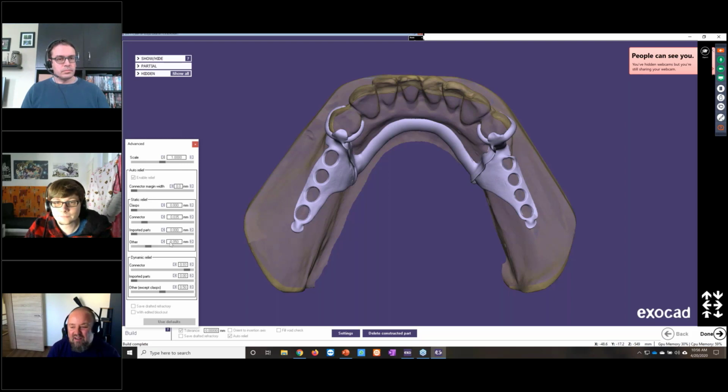And yeah, this is something hard to explain. To be short, it's a kind of tool compensation and compensation of bad scan quality and triangulation all together. So it's seeking for edges on the triangles and doing a compensation in those areas to create gaps in such areas who can create problems in the fitting later. To be honest, I have no experience with real values here. Yeah, it's hard to suggest specific numbers, and like we said, it's something that we'll have to do through trial and error on your actual components, on your parts.